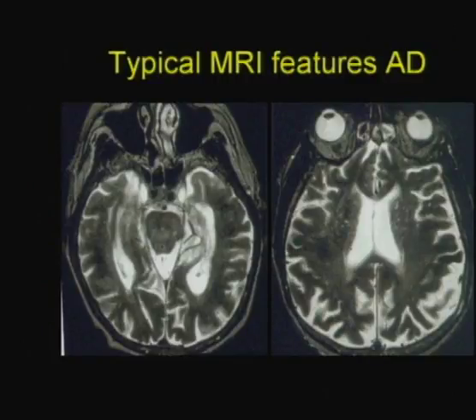What you see on your left is the characteristic atrophy of the temporal lobes. Notice that the left one has a lot more atrophy than the right in this particular case. It may be the left, it may be the right. It's very often asymmetrical. It may or may not be symmetrical. And when you get higher up towards the level of the ventricular bodies, you notice that there isn't all that much atrophy. It just looks like any other older individual with so-called age-related volume loss.